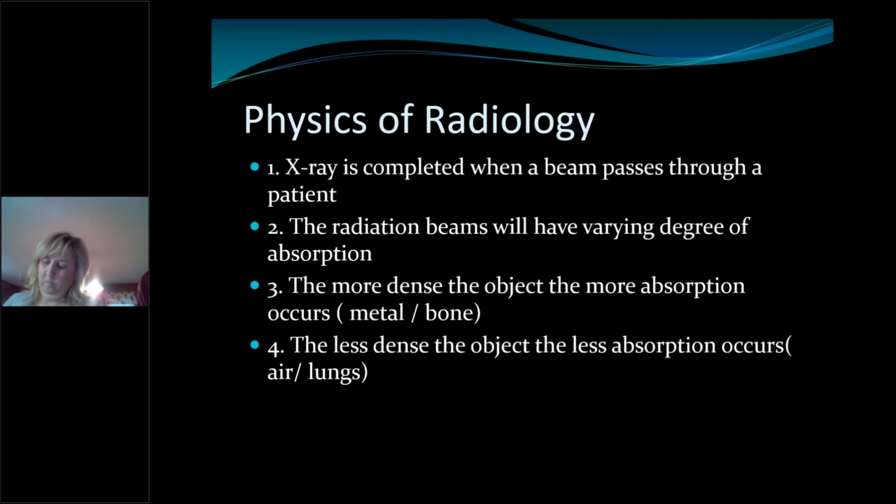All too many times I'll have students look at an x-ray with me and they say, well, that white squiggly line is a fracture. And I hit them with the stupid stick. And I say, no, a white squiggly line is dense, not absence of density. If something's broken, there's discongruity, there's absence of density. So it is not a fracture line. Think about that when you're looking at an x-ray.